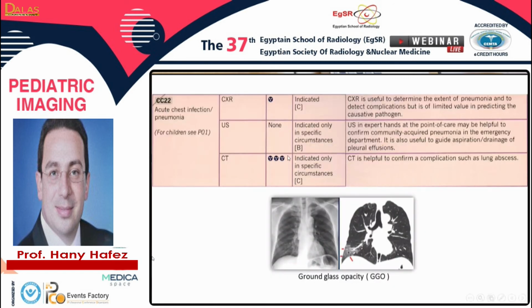Clinical imaging guidelines begin in acute chest infection with chest X-ray and then CT scanning in special considerations. That's plain X-ray. The lesion is not defined in plain X-ray, and in CT scanning coronal cuts, due to better resolution, the ground glass opacity is seen here.